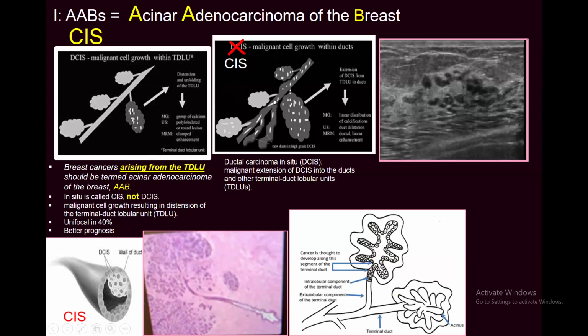You see, a long-term prognosis. But it can be multiple or multifocal. You see, it can spread. If you look here, this is large. It might arise in this lobule and then spread to cancerize the ducts and extend into another lobule to cancerize it and make it multifocal. But still, it can arise in all these together at once, simultaneously, representing the sick lobe syndrome.